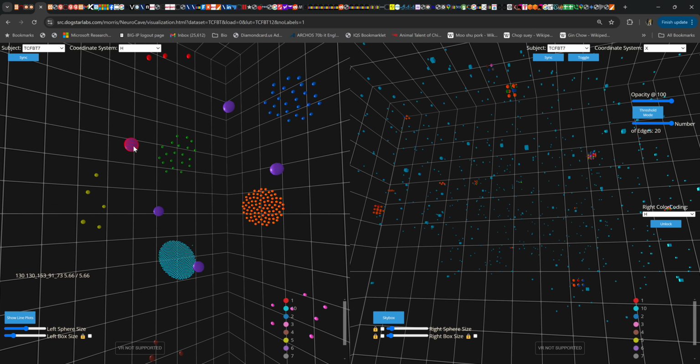And so you can click on all of these cluster members and see which anatomical regions they're targeting there.